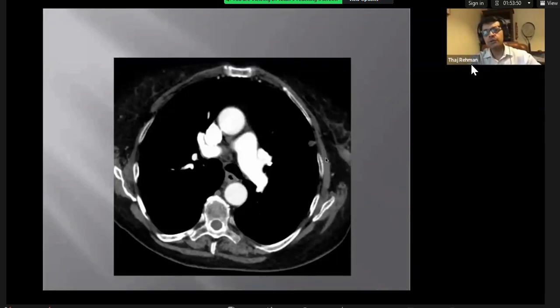So what you do is you compare it with muscle. Muscle is the typical rule of thumb soft tissue density structure. So you can see that the periphery is similar to muscle, but the inner part is fat, similar to subcutaneous fat. So that's a hamartoma, a fat-containing hamartoma. You did very well. You did eventually pick up the chest X-ray finding, asked for CT, and then you did diagnose the hamartoma. So fat is diagnostic of a benign condition, which is hamartoma. All right.